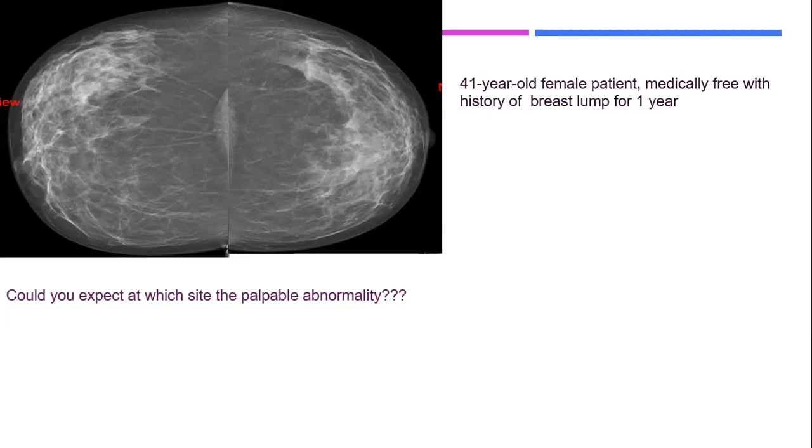Even you might see it with less breast density and more intervening fat, okay? But due to the heterogeneity and complexity of the underlying breast parenchyma, the appreciation of underlying lesions will be difficult. This patient has an abnormality in the right breast.